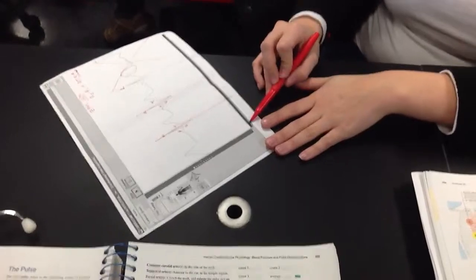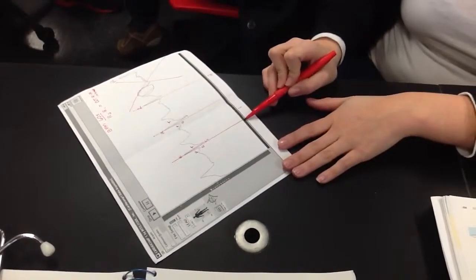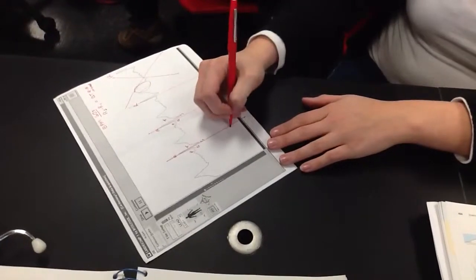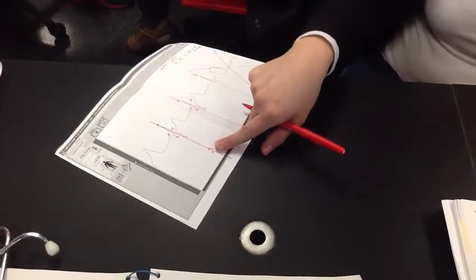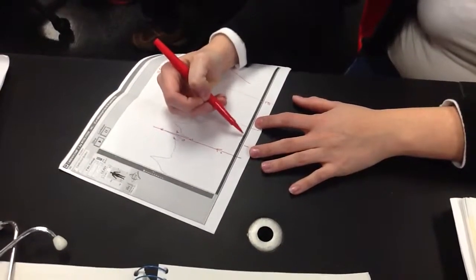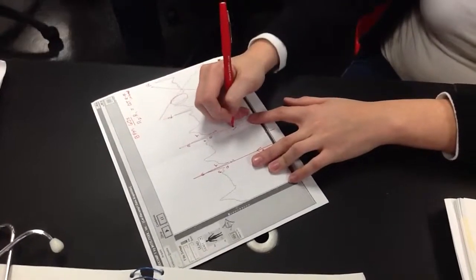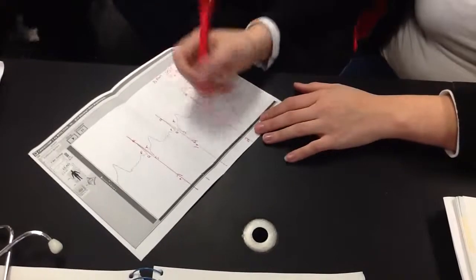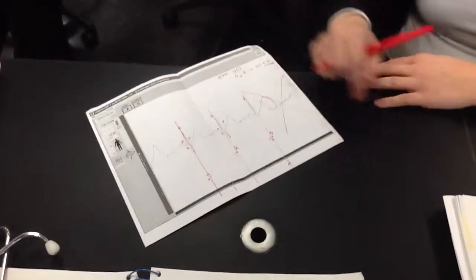Okay, so what we're going to do then, so let's count. 1, 2, 3, 4, 5, 6, 7. So let's just pretend this is at 0.7. Okay? Because it's at 0.7 because it's a tenth. Now, the next one, we're at 1 right here, then 1, 2, 3, 4. So this is 1.4. Okay, let's do our next one. This is going to hit the 2 mark. This is at 2. Does that make sense? We're just counting over. Okay?